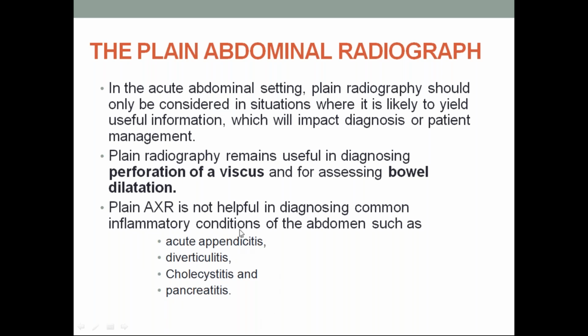The one thing we will recognize is calcified chronic pancreatitis. In that condition, the calcifications will be visible on the abdominal radiograph. Similarly, if the appendix is calcified, or in porcelain gallbladder and chronic calcified pancreatitis, these things will be possible to recognize on abdominal radiograph.